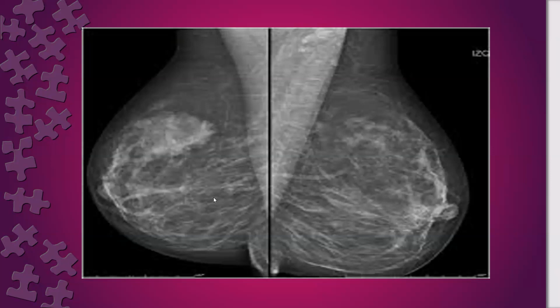Wow. Do you have any observation that this side might be aggravated by something to be smaller compared to the other side? The discrepancy might be much less than this, but there is something that makes it a more aggravated discrepancy in size. So here, regarding the quality, tell me, is it an optimum MLO on both sides?